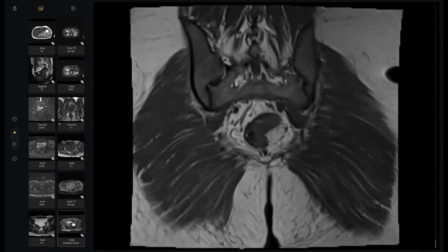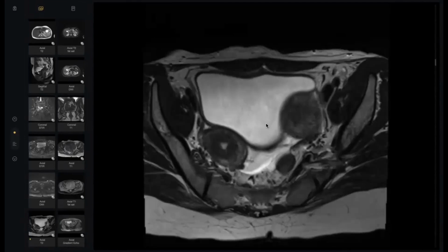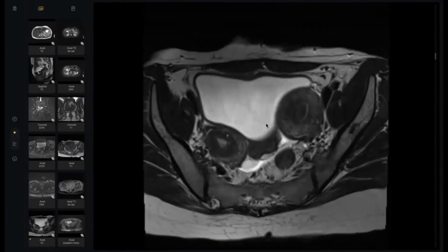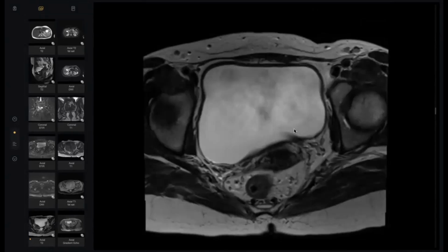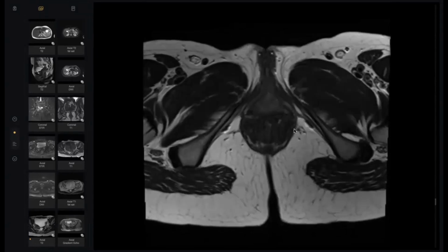One second, doctor, I will help you. Look here, please. What happened here? This is the uterus in T2-weighted images, uterine cavity. There are two uterine cavities. One of them is here. I would like to see their lower extent. So there is a single cervix.